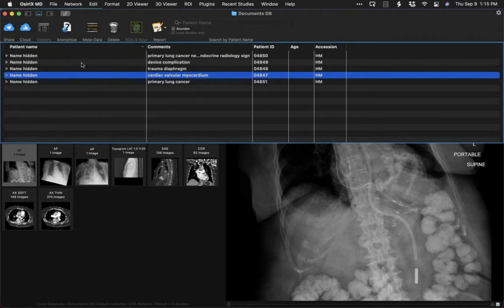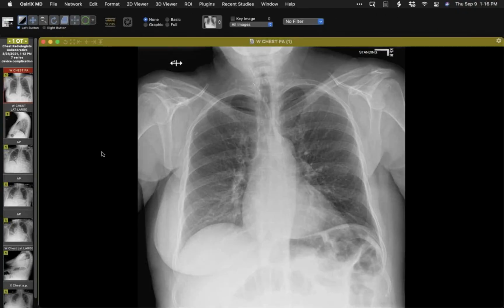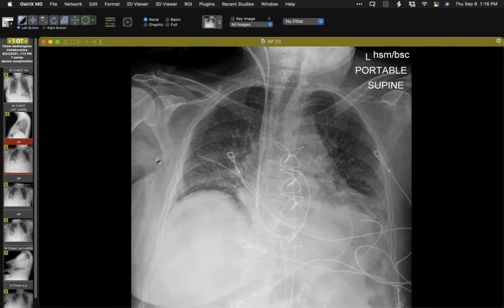This is just an example of perception and postoperative radiography. So I will show you this patient had surgery, and here is an image that I read on the first post-op radiograph, and I described everything to be okay in terms of support devices, catheters, leads, and so on.